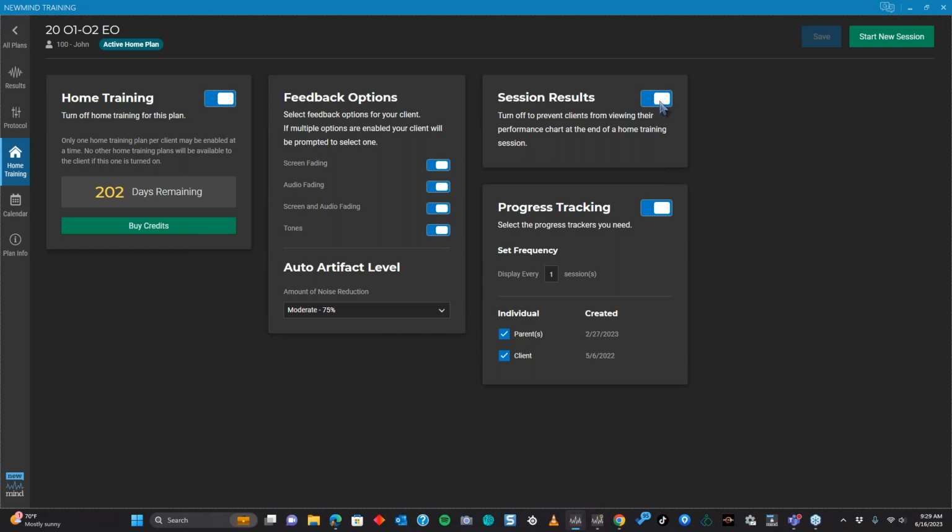So as a clinician, you get the option of whether or not they see that point scale. If you feel you have a client that's heavily anxious, you might want to just not turn that on, and instead you can even have a technician check in with them once a week and give them a little update. Hey, I've been looking at your sessions, everything looks fine.